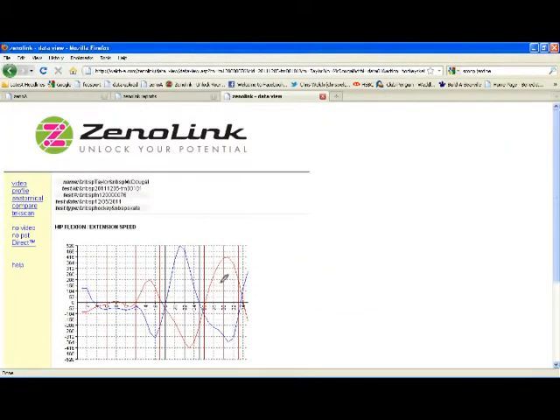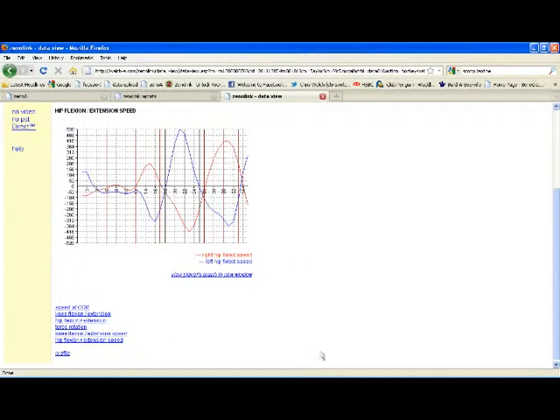We'll take a look now at the hip. Again, at the hip, we're looking for roughly the same pattern. About 300 on the push-off; the push-off extension speed's a little bit lower than the other two gait cycles. But again, we're looking for that extension speed at the hip to be at least 350. We see it coming in about 312. So the extension speed is on the low end, and flexion speed, again, is off.